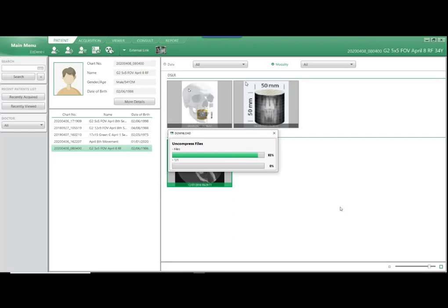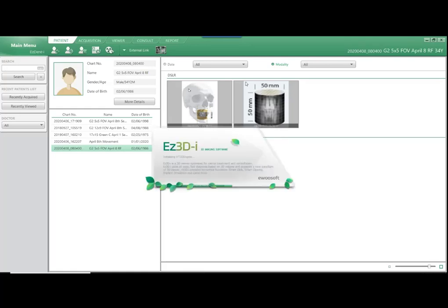Honestly, we've looked at some of them today, drawing the curves different ways. We've also talked about changing our intervals. One thing we have not used is our oblique tool, but this is one thing that I always suggest to my doctors: start getting our radiologists involved, you know, if we do need to look for different pathologies, or our specialists for these root fractures.